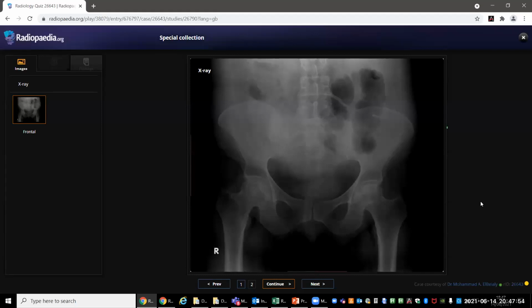or the vertebral bodies do not appear H-shaped. I do not see any ankylosis of the interspinous processes. I would also ask if the patient has any lymphoproliferative disease like lymphoma or leukemia. In short, what I can see is bilateral avascular necrosis of the femoral head. I would discuss with the clinician and try to find out the reason for this avascular necrosis. Otherwise, this would be labeled as an idiopathic AVN and would be referred to orthopedics for management.